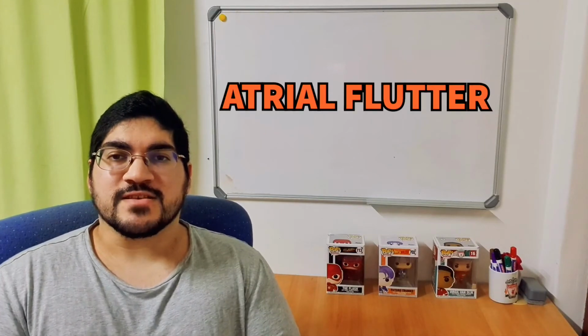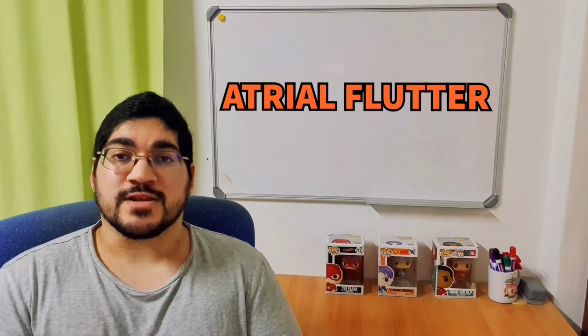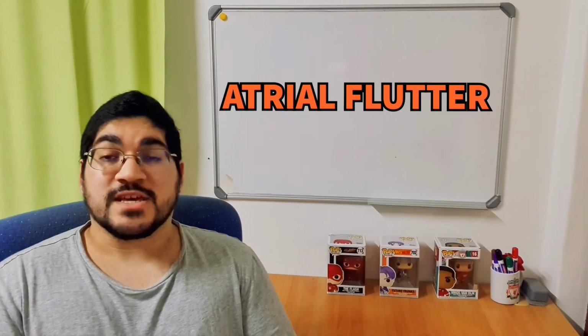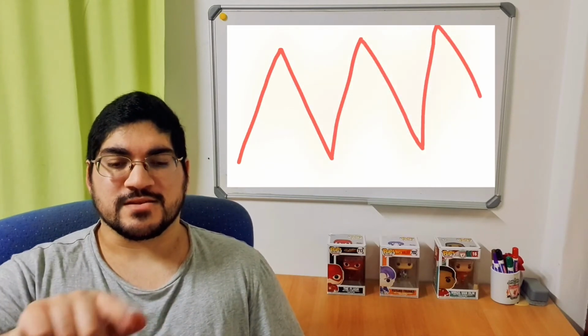The next one I want to talk about is called atrial flutter. Now, atrial flutter means that there are impulses being created in the atria that are not being translated to QRS complexes because they're too fast. So the AV node acts sort of like a pacemaker, where it doesn't allow impulses through because there are too many impulses being generated at once. So when you get a single atrial pacemaker releasing impulses very quickly, you call that atrial flutter, right? And that's characterized by the sawtooth pattern. So like 2 to 1, 3 to 1, you'll get a sawtooth pattern happening before your QRS, where the P waves look like little shark teeth.